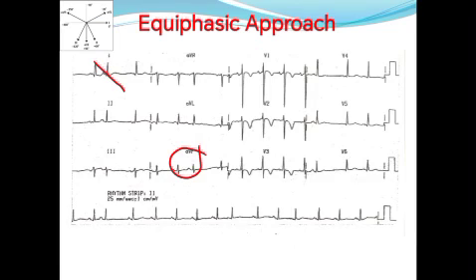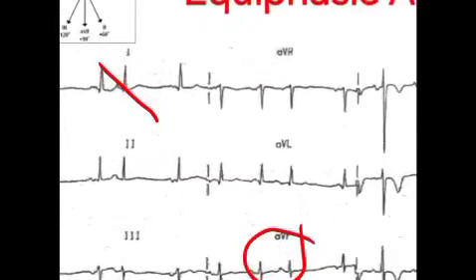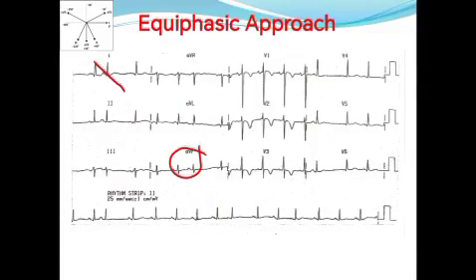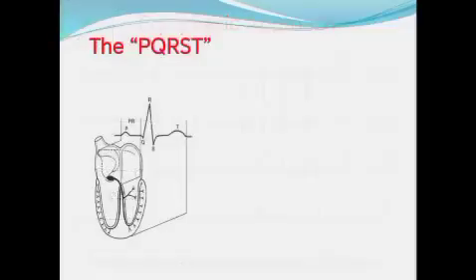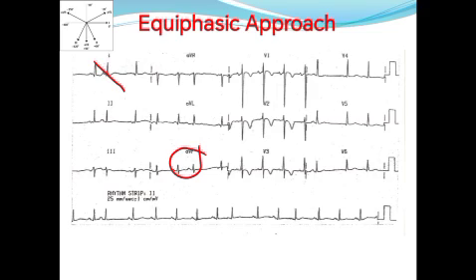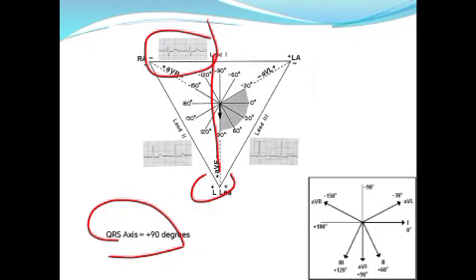This one is the AVF, and so the 90° corresponding angle is 0. You see, 0. It's simple, but you need this shape to be kept in mind to determine the angle.